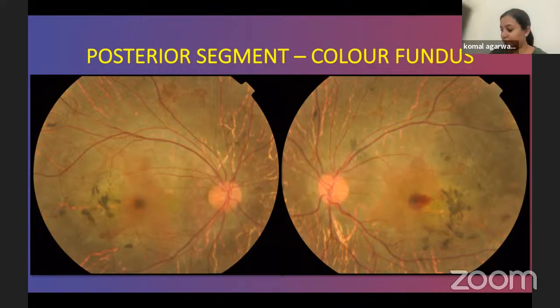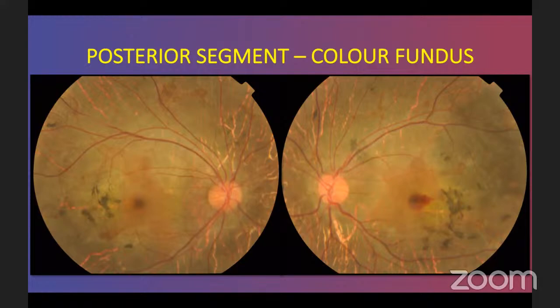Yeah, it's a very interesting case. I have never seen a case of CNVM in choroideremia. This is very classical. Most of the time, any dystrophy can have subtle CNVMs. Most commonly, as Dr. Vishal said, BEST, once they go into the atrophic stage, they may develop CNVM more commonly. I also see it in Bietti crystalline dystrophy, which is a variant of RP. I have seen two to three cases developing CNVM in those conditions. And another condition I have seen is Sorsby dystrophy. So for these three, I usually have more follow-ups.